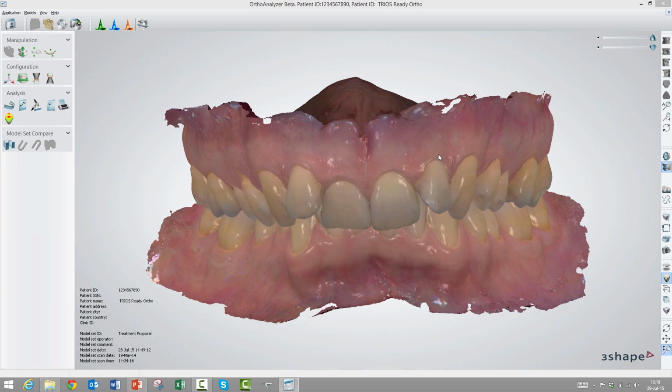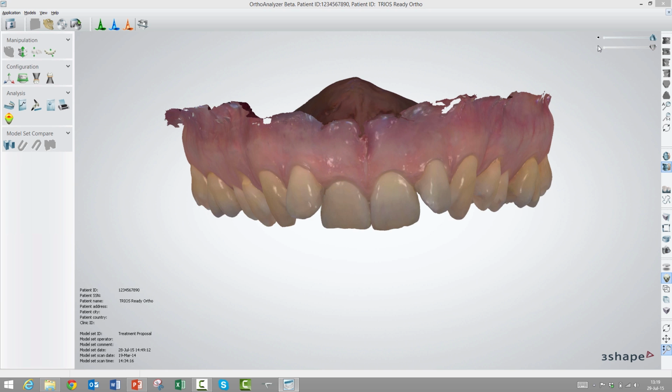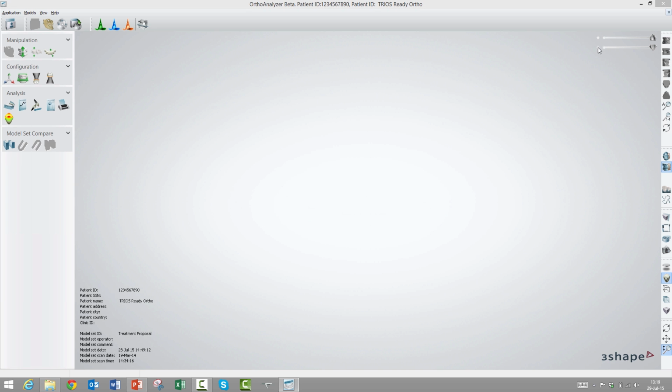Okay, let's zoom in here. The next thing I want to show is how these sliders work. Sliders are some of the panels you see up here in the upper right corners. We call them sliders. As you will see when you go into some of the other videos, you can have lots and lots of these sliders down here. Right now I just have two, one for the mandibular and one for the maxilla, so the upper and lower jaw here. And you probably guessed it, you can remove one of the jaws by simply deselecting one of them here, both of them or one of them.